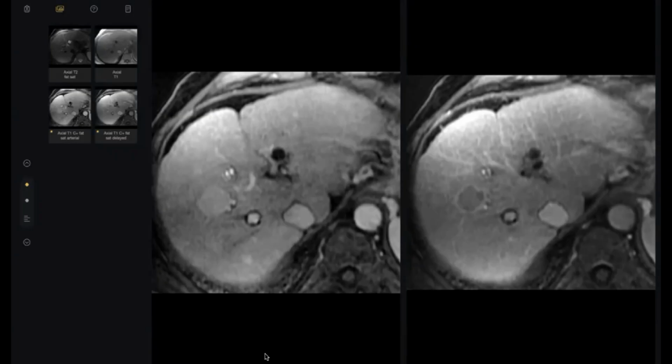So the next step is to correlate with the alpha fetoprotein level and to see the entire study if it is invading any vein, to rule out the criteria for TACE and refer for TACE, and to see the multiplicity and synchronicity of the lesions, and portal vein invasion, and to see if any lesion in the portal vein shows arterial enhancement. Okay. What is your next step? Do you want to do a biopsy or not? No, I think biopsy is not needed. AFP, alpha fetoprotein correlation, and refer to MDT for TACE.